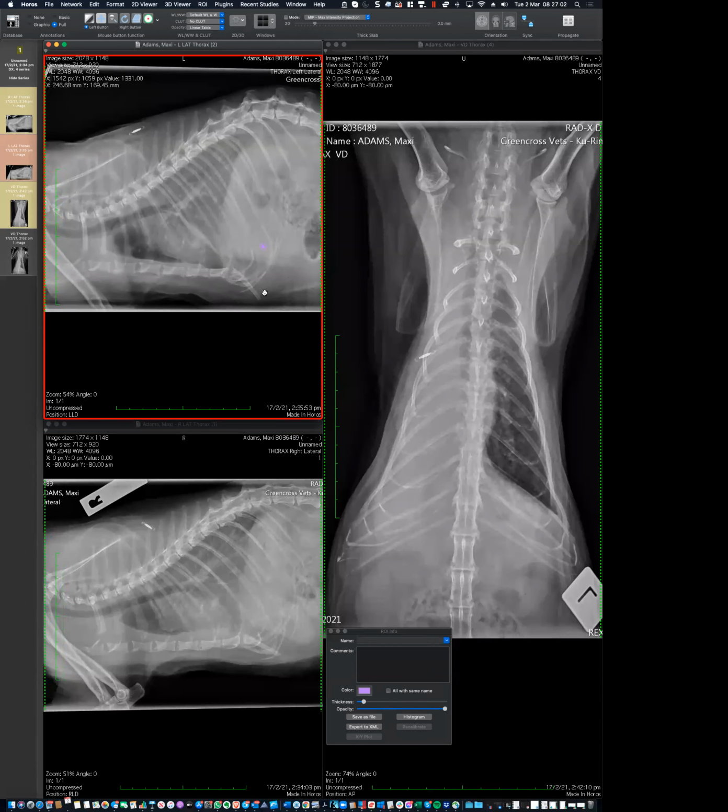I can see more fluid. It looks like there's greater fluid on the right lateral, but it may just be positioning. But I feel like there's a big mismatch and I can't find where the opacity has gone. Is it just fluid that's shifted, or is the left lung expanded so much that you see it on the left lateral? Good, lovely. And it's good that you put your frustration out, and then we'll try to explain it.